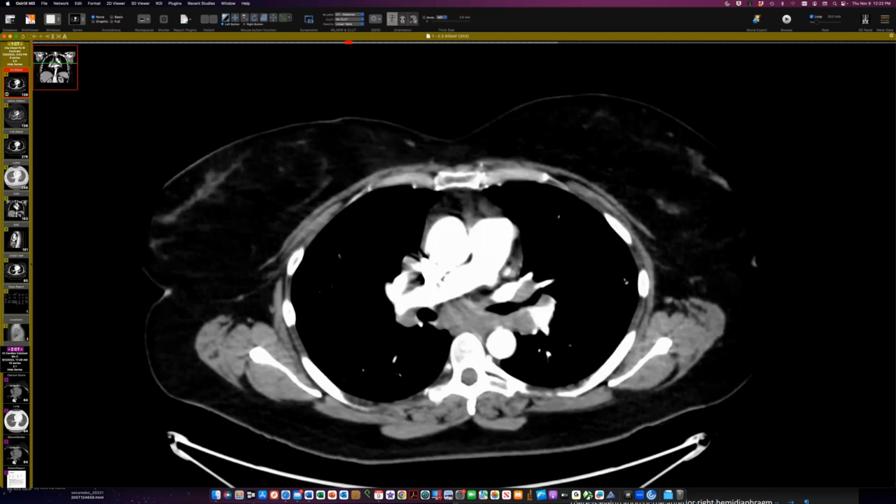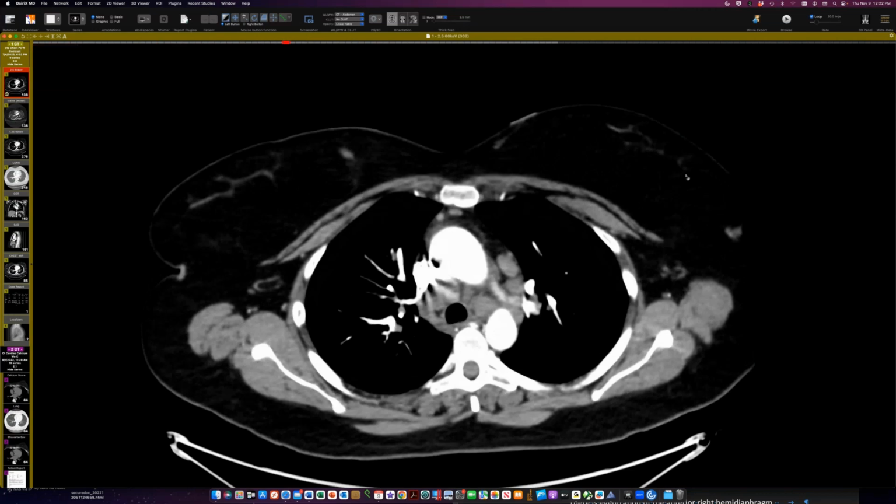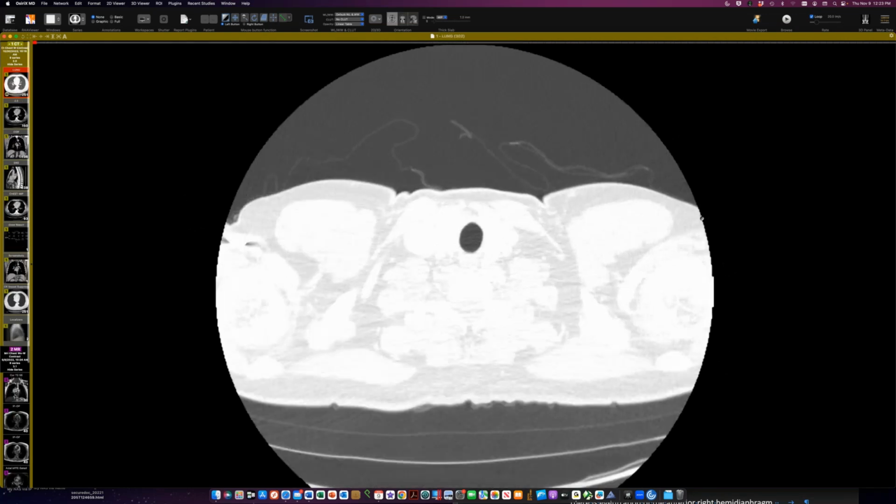So we think this is kind of a secondary sarcoid or sarcoid-like reaction in the setting of this Humira therapy. I showed a case related to nivolumab a few weeks ago, and here's a case related to Humira, a sarcoid-like reaction in the setting of inflammatory bowel disease. Yeah, it seems to be more common with TNF alpha inhibitors than checkpoint inhibitors, the sarcoid reaction. Okay. I've also seen it with interferon. Yeah, people getting interferon for hepatitis C. Got it. Okay. Yeah, I think I had a case of that too.